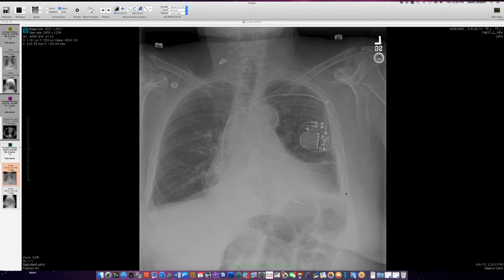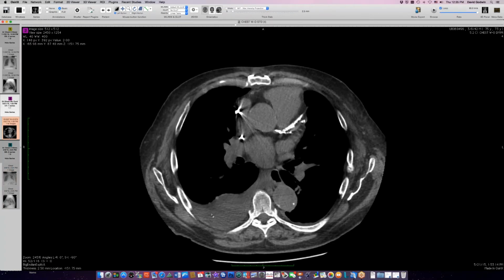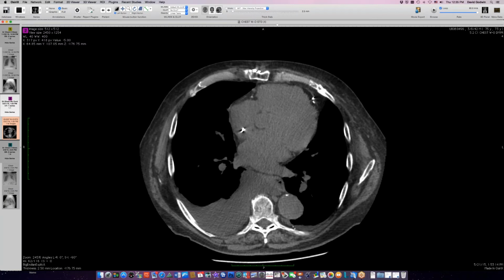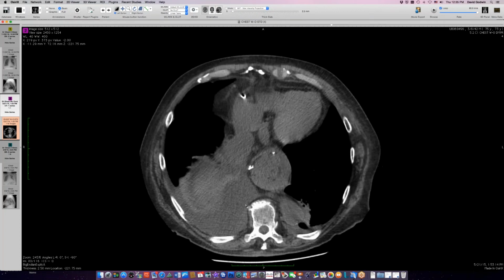I think he also has some pleural effusion on the left in addition to the pleural thickening that was already there. And he got this CT scan, which documents pleural effusion. At this point, it's larger on the right than it was on that radiograph, and just a small amount on the left. They tapped this effusion. The usual consideration in heart failure is a transudative effusion in the setting of left ventricular failure, although his ejection fraction hadn't changed. But this was an exudate.